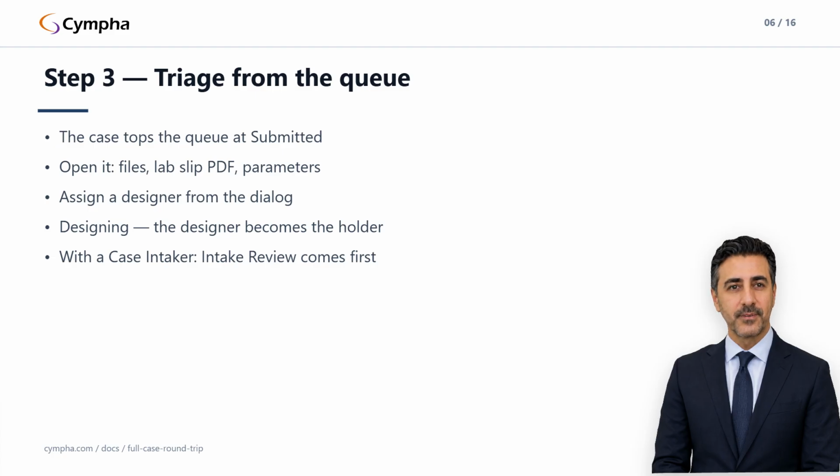Step 4 happens without anybody clicking anything at all, which is why people miss it. On its next poll, and the agent checks for new cases every 20 seconds, the designer Cympha agent manager downloads the case files onto their machine.